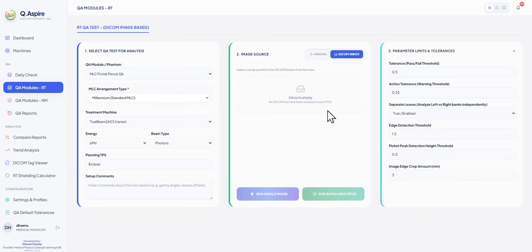Okay, we have to configure that in both the systems, in that Varian system, which is possible. It will pull those images, and after pulling those images, we have to do nothing at all. Simply click analysis. It will automatically segregate the images. Whether that particular DICOM file is for field size analysis, it will automatically move it to the field size analysis. And the same way for Cat Phantom analysis, and then CBCT images will directly move on to that CBCT analysis.